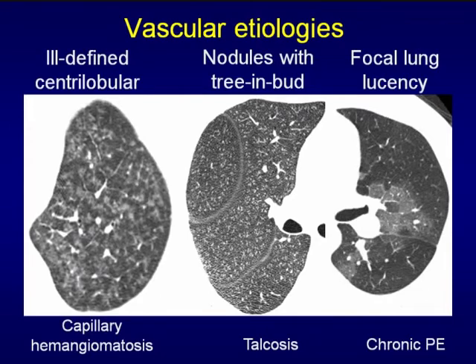Always remember that at the center of the lobule is both the bronchiole and the artery. And so processes that affect the center of the lobule may be both airways related or vascular related. Now the airways diseases are by far the most common, so when you see one of these patterns, that's going to be right at the top of your thought process of the diseases, what's causing this. But there are certainly vascular causes of all these patterns, which I'm not going to get into a lot of detail about today. But when I think of these, patients with pulmonary hypertension would make me think of these diseases. Patients who have maybe very diffuse abnormality, like 3 days of symptoms, you think of hemorrhage or edema or something like that. So keep this in mind, that this is always in the differential diagnosis.